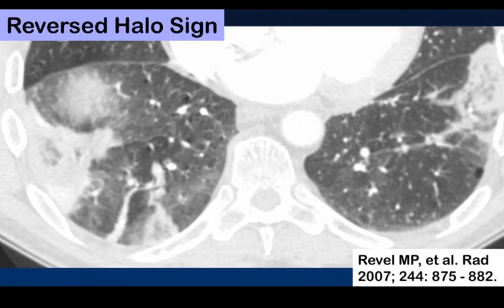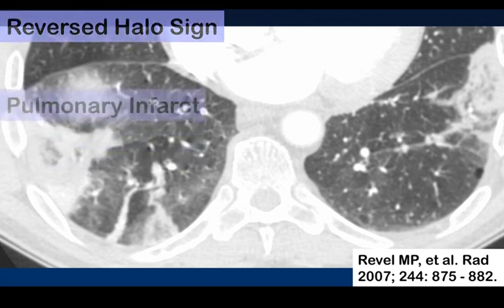Now, I mentioned pulmonary infarcts on CT earlier as having a very characteristic shape and characteristic internal lucencies, and to some degree, these can look like a reversed halo sign on CT. However, in patients with infarcts, the central areas are often not homogeneously of ground glass attenuation, but demonstrate bubbly central lucencies, often looking like a stool-filled colon, and sometimes it's been called the pseudocolon sign as well, but it is included in the differential diagnosis for reversed halo sign.